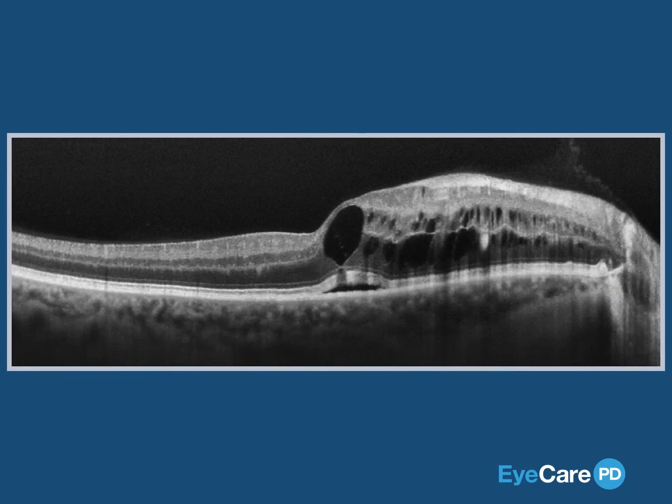The result is a mild extent of inner retinal opacification on the OCT image as seen here. When you combine inner retinal opacification with intraretinal fluid in a diffuse manner located in the outer retina, you can be pretty certain this represents a retinal vein occlusion.